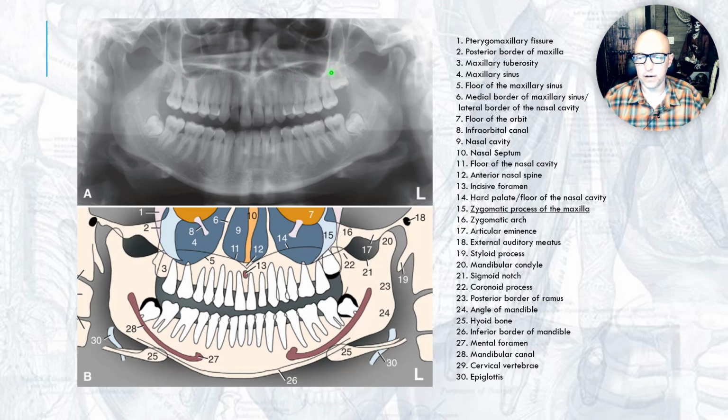Why do you need to identify these? Because the patients can get sinus carcinoma, squamous cell carcinoma of the maxillary sinus. That can destroy borders. If it starts to destroy these things, they show up fairly well on a panoramic radiograph. This is within the focal trough. That's why you see that corticated border so well. So anything that you can see very distinctly, and I guess maybe one of the fortunate things about pano is you don't see a lot of the skull base, at least not in focus. But you will see into the middle cranial fossa.